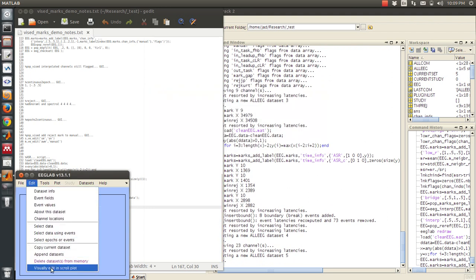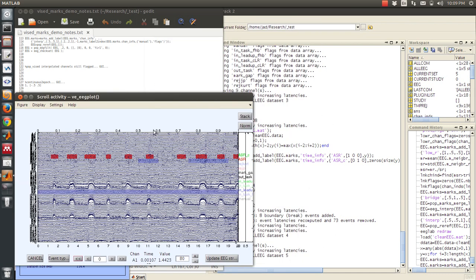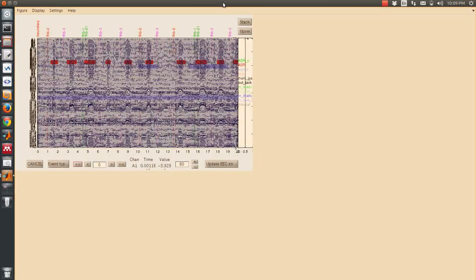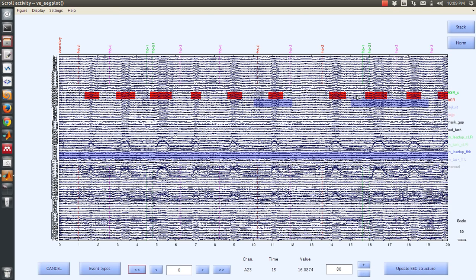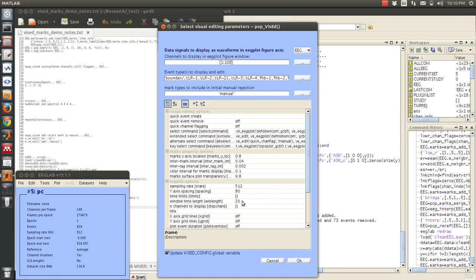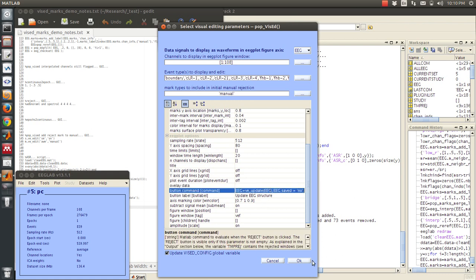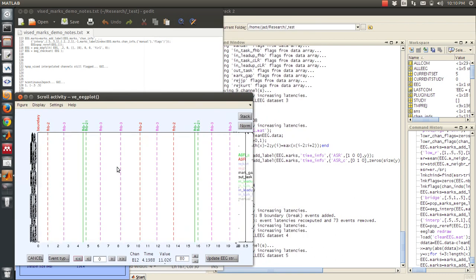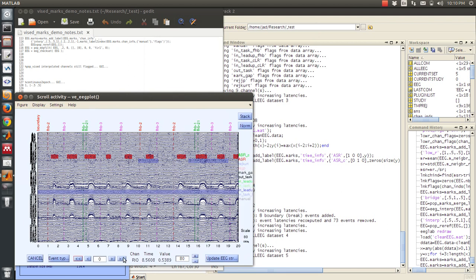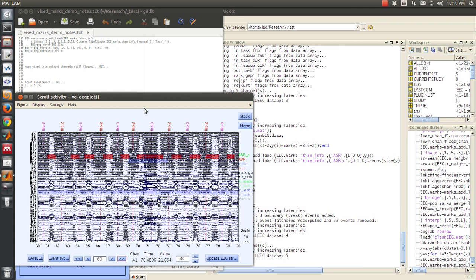Now if we look at the data using the same plot, we can see that it's overlaying something here. I gotta get rid of the overlay. Get rid of the overlay data and plot the data that are left. And then we can scroll through and we can see that the data had been removed if I asked it to.